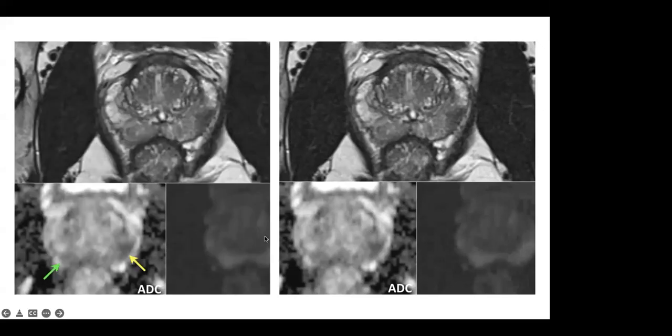When we look at the ADC mapping and the diffusion, on diffusion it is not behaving differently from the rest of the peripheral zone, while on ADC it is slightly hypo-intense but has well-defined margins, unlike the lesion that we saw. These kinds of lesions, which are wedge-shaped or very well circumscribed with well-defined margins, are usually secondary to prostatitis, and the biopsy confirmed this lesion to be prostatitis.